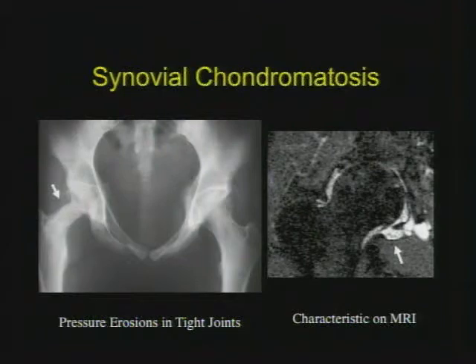But this is a classic. Other filling arthropathies or defects, things that cause defects, are synovial hemangioma, amyloid. Those would be some things to think about.